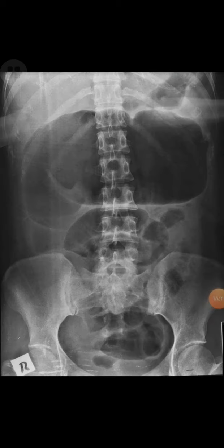The acute fulminant presentation of ulcerative colitis is toxic megacolon. We say that barium study is contraindicated in cases of toxic megacolon. The only tool for diagnosis of the condition is a plain abdominal film. This is a plain abdominal film showing huge dilatation of the transverse colon. A transverse colonic diameter greater than 5.5 cm or 6 cm is diagnostic for ulcerative colitis with toxic megacolon.